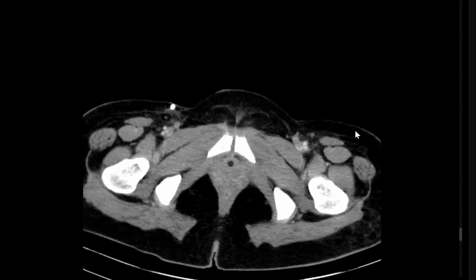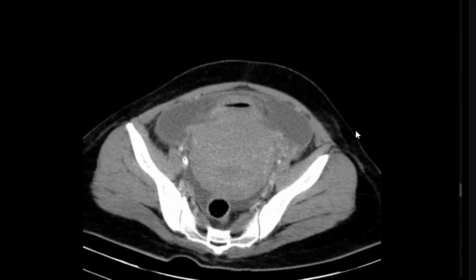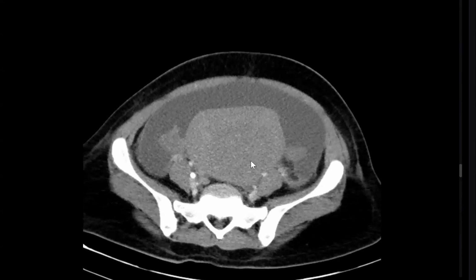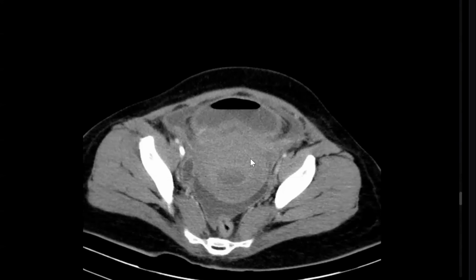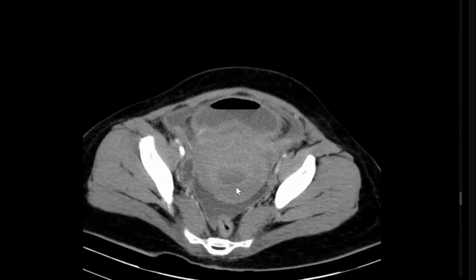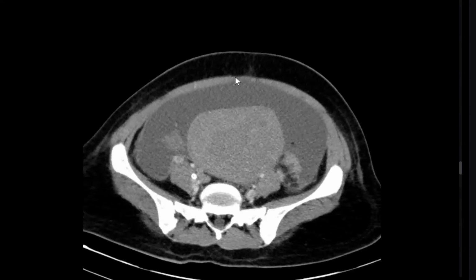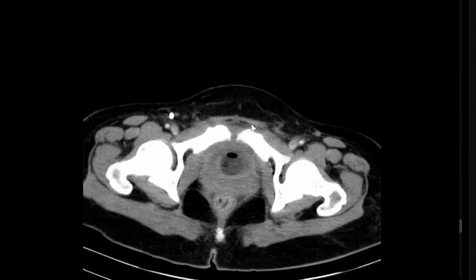I'm looking at the uterus as the patient is postpartum. The uterus is slightly bulky. I'm trying to figure out whether there are any signs of perforation or wound dehiscence. I cannot see any anterior abdominal scar, so I will check the pelvic region.